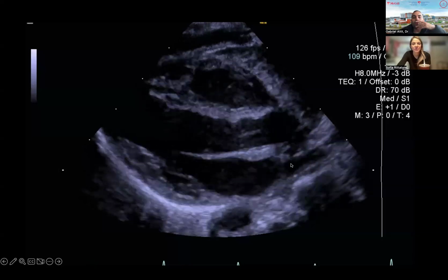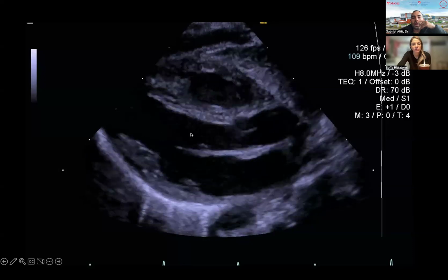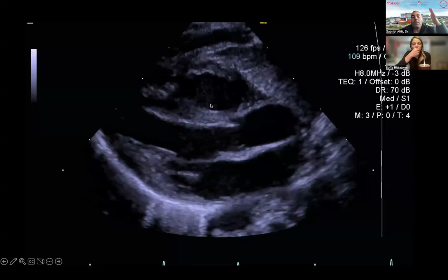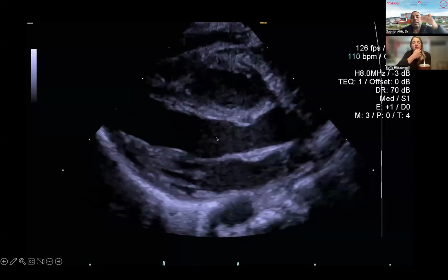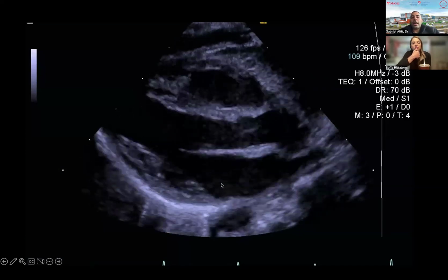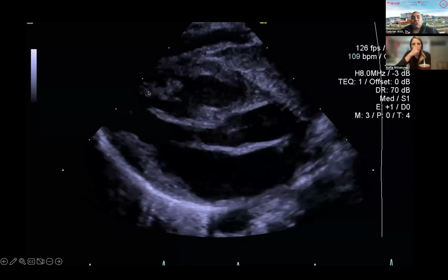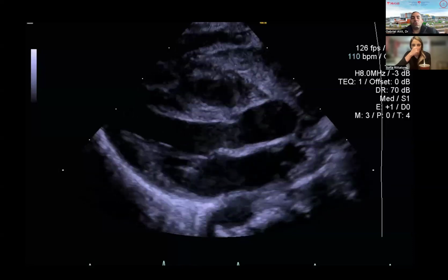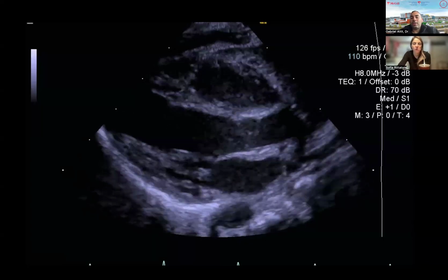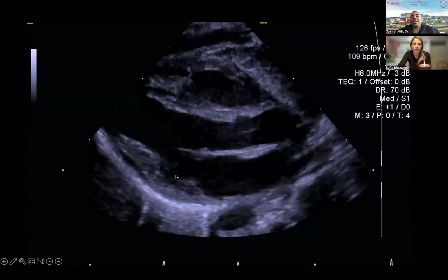Yeah, it's clear. You can also do that in the parasternal long axis view, where you would put your line ideally through the tip of your mitral valve. But you can see that if your parasternal long or short axis is not taken at a cut that is exactly giving you your ascending aorta, your LA, your descending aorta, and your LV posterior wall and septum, and because your heart might be shifted in the chest, if there's a pneumothorax, a CDH, or if basically you have poor windows, you might be cutting your LV in a place that you're not well angulated. So you have to be very careful. And so that's why, for example, ASE in the pediatric and adult world, they even measure it in 2D.